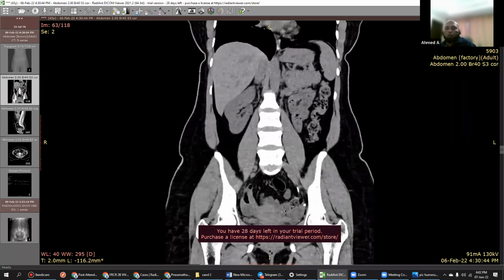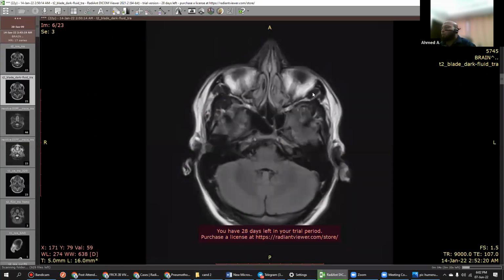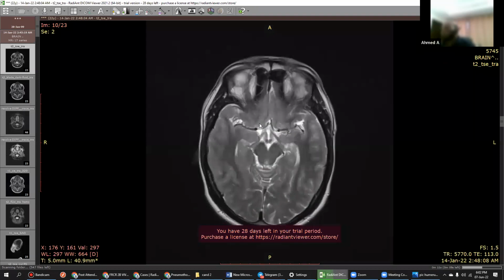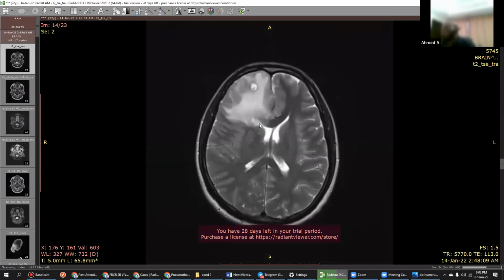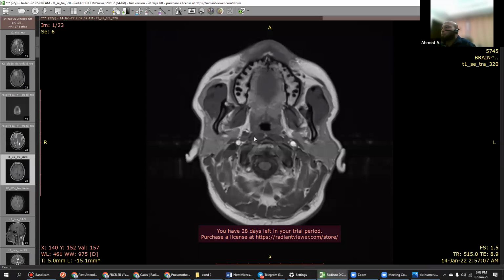It is just a matter of finding it. This one you were right, you did well, but to get more good marks, you have to be more specific in cases like this. What is this? Anything you can make out?